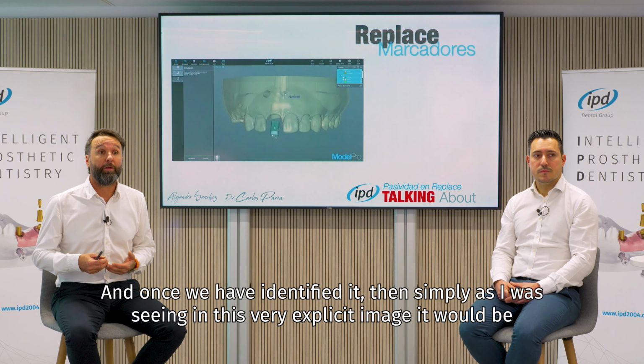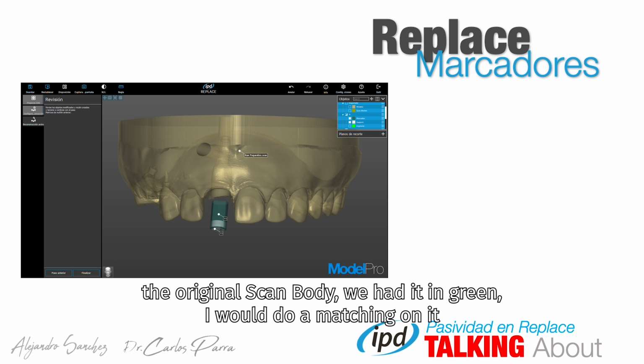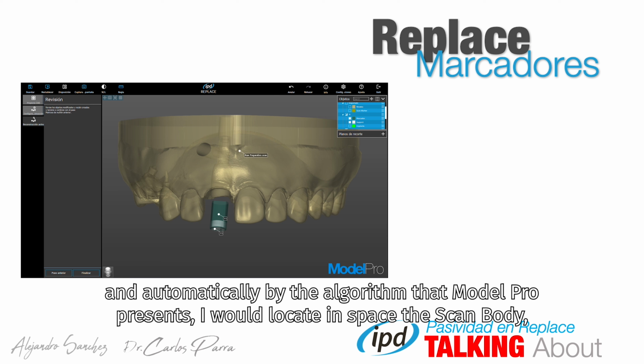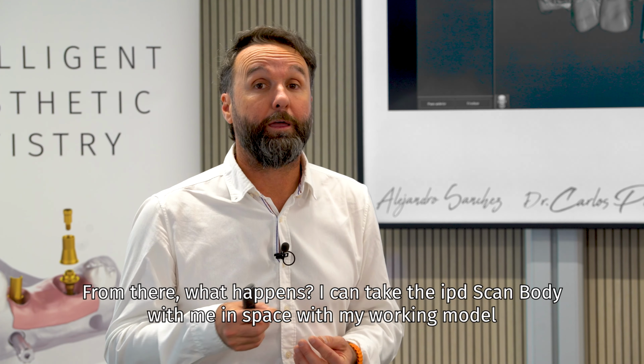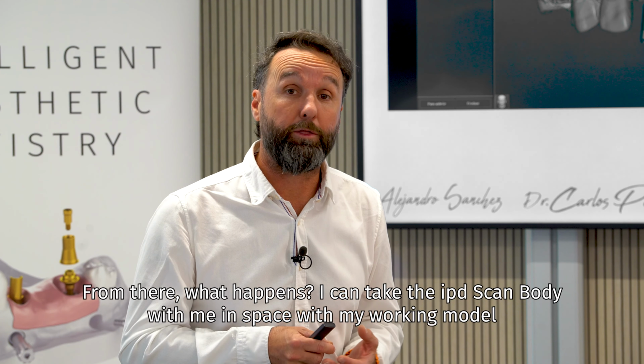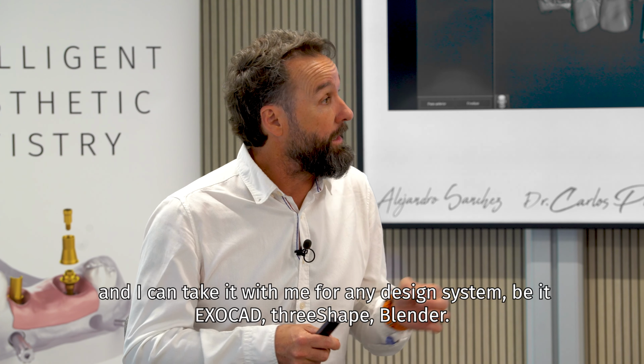And once we have identified it, as I was seeing in this very explicit image, the original scan body we had in green, I would do a matching on it, and automatically, by the algorithm that Model Pro presents, I would locate the scan body in space, both rotational and anti-rotational, whether it is an individual piece or a multiple reconstruction. From there, what happens? I can take the IPD scan body with me in space with my working model, and I can take it with me.